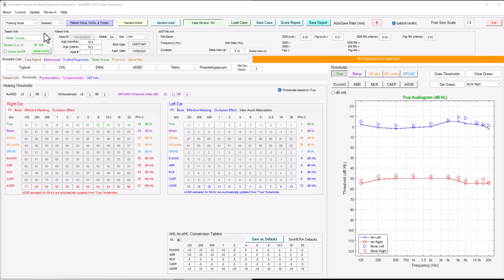We have this patient already selected here. You can see over here on the right, unilateral loss, and we're first going to showcase how we can do behavioral audiometry for the left ear, which is of typical hearing status. There are different approaches to this. In different clinics, we'll do things slightly differently. I'm going to first show you what is recommended through the ASHA guidelines, which is called an ascending approach to find the initial thresholds, and then I will showcase a descending approach.